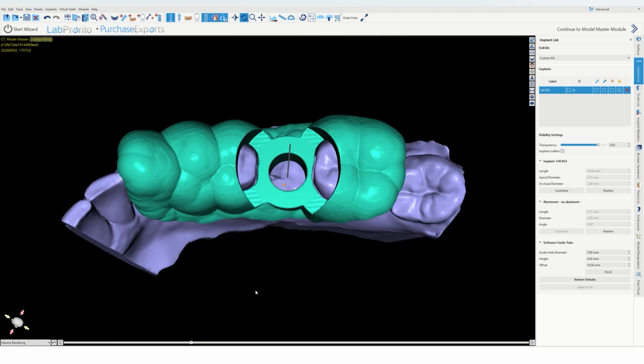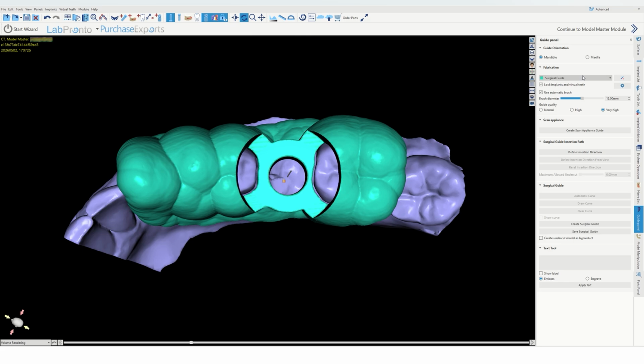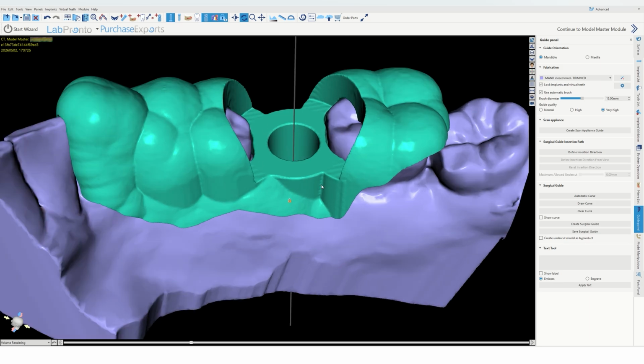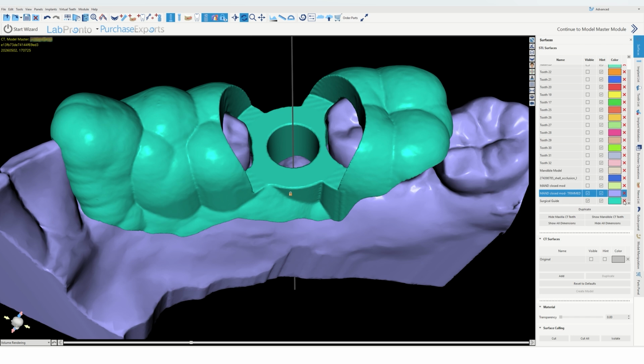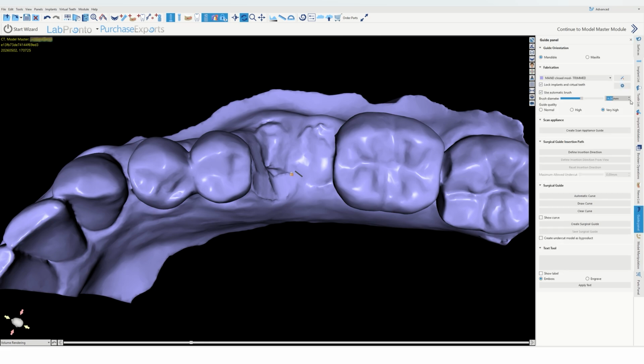Let's say that, okay, we talked for a minute about this brush diameter up here being 15. What does that mean? That means that from here to here, that circle that it created is 15 millimeters wide. That 15 millimeter wide brush made this get a little bit thin. So let's delete this surgical guide that we just made, right? Go back to guide panel. Make this like, say, 12.5.